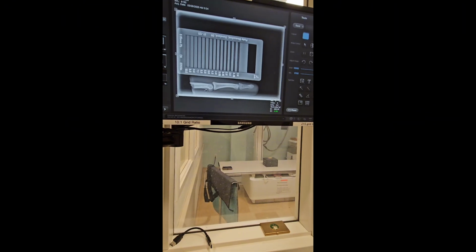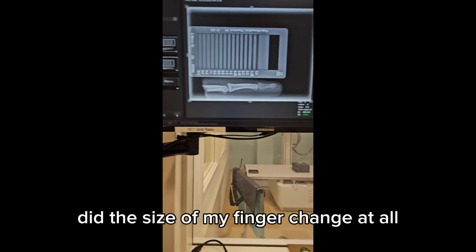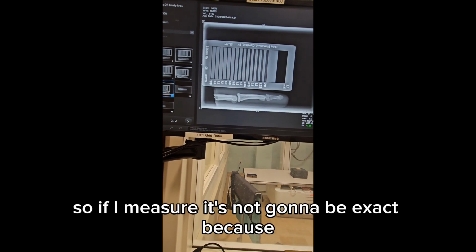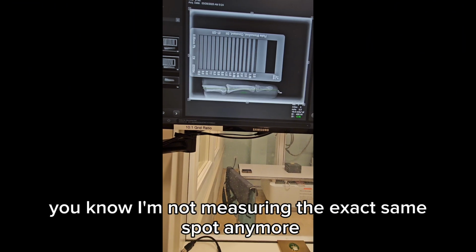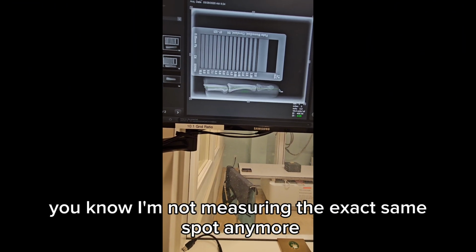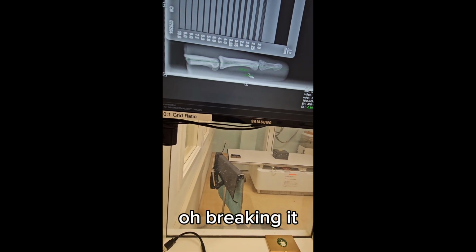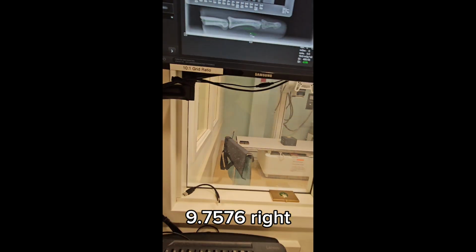Now, by changing mAs is the only thing I've changed here. Did the size of my finger change at all? No, right? So if I measure, it's not going to be exact because I'm not measuring the exact same spot anymore. But basically, it's the same size measurement, right? 9.7576, right?